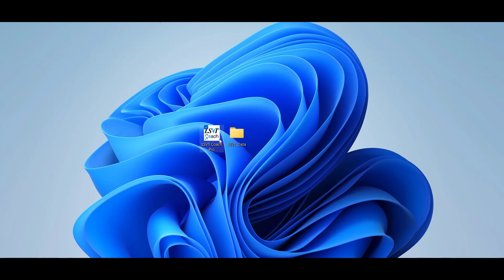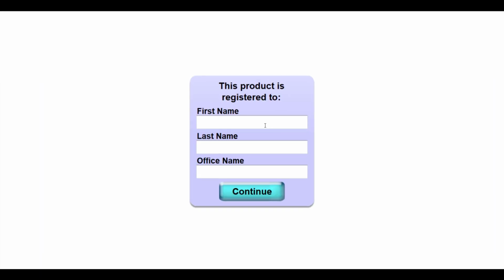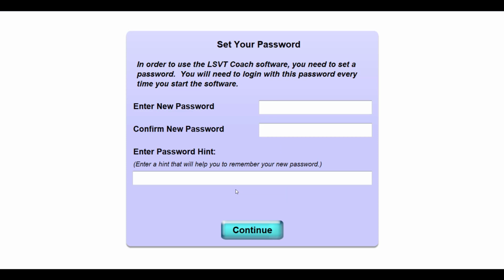To finish off the installation of the LSVT Coach Professional Edition, start by clicking on the software. And this should be the very first screen that you are greeted with. This product is registered to, and you will want to start by registering this product to yourself by entering your first and last name, and the name of your office. From here, you will be asked to set a password for your LSVT Coach. And then go ahead and press Continue.